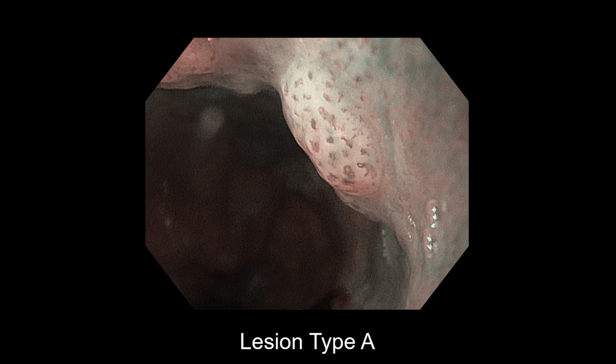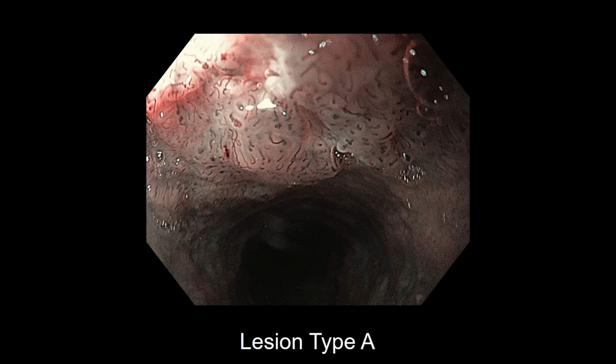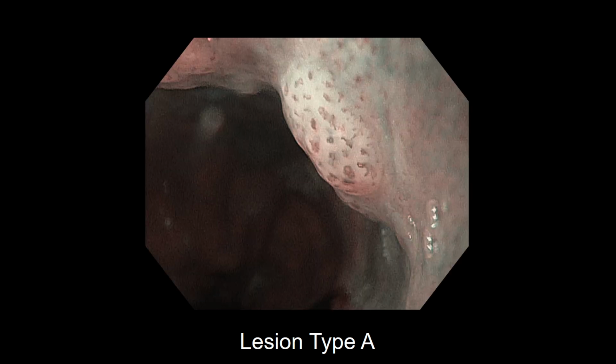Our purpose is first to try to describe the lesions, the different kinds of lesions. Your opinion, is it mucosal, is it submucosal? Later we will see the operative specimen, and we discuss with the pathologist what they have found.